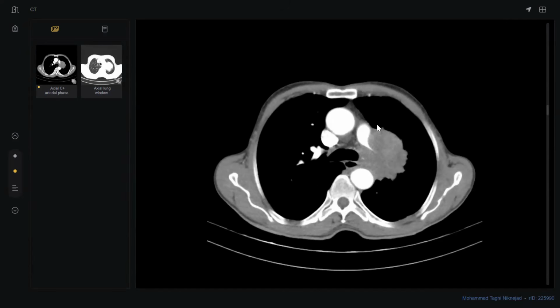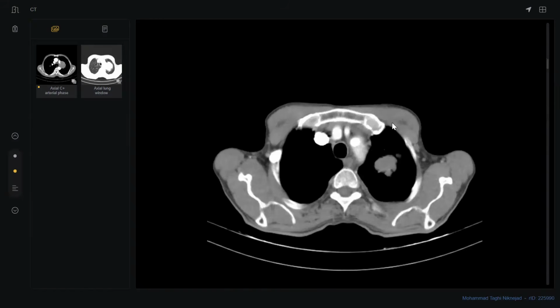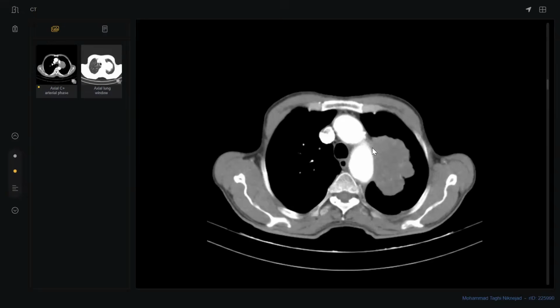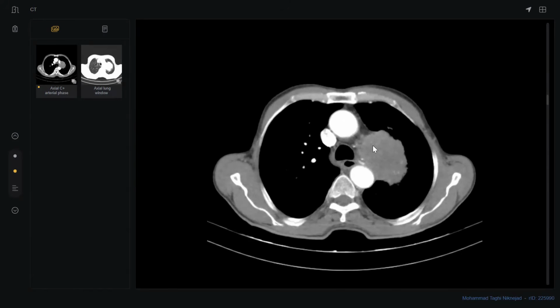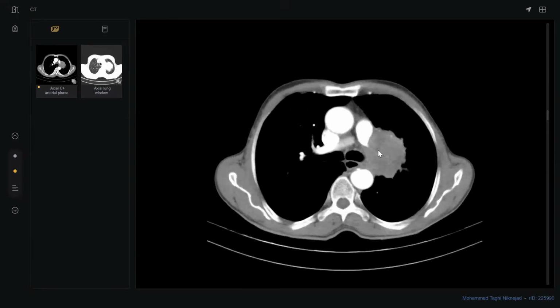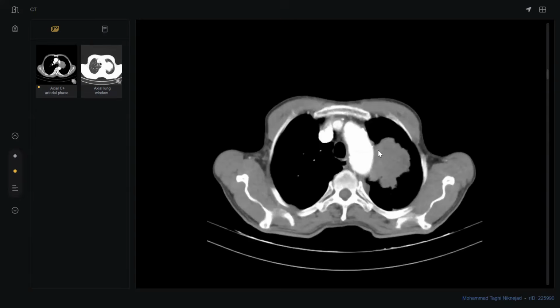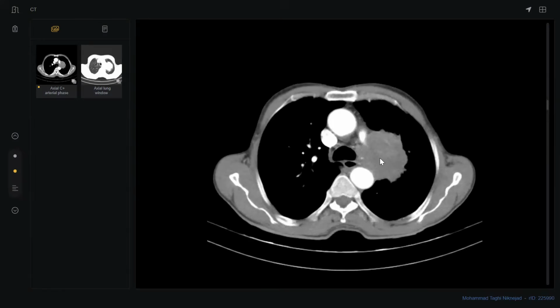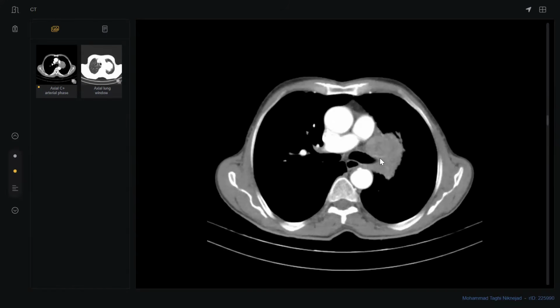Please scroll and describe. Give me more information. Okay, so I'm just going to check the vessels. Superiorly, this mass has an indistinct border with the aortic arch, and it is extending medially till the left paratracheal region. Now I'm looking for the involvement of the vessels. It is causing complete encasement and obliteration of the left pulmonary artery.